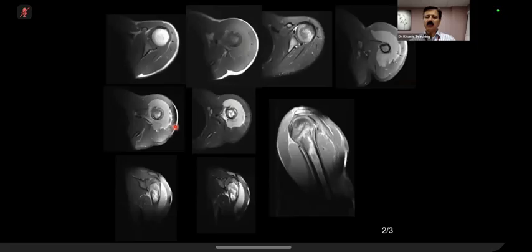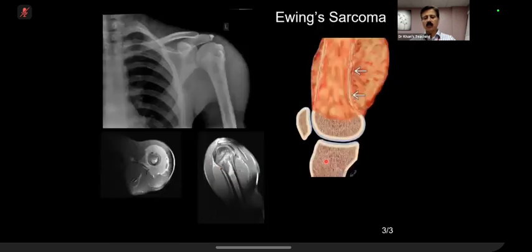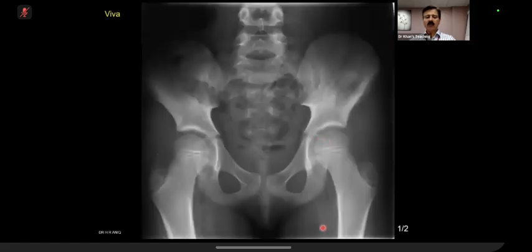Number two, lymphomas in this age group with this kind of radiology are much rarer. Out of 100 cases, maybe 5 of them might be lymphomas. But radiologically speaking, yes, lymphoma can be kept in the differential with this fine print that the soft tissue might not be as much. So this is classical Ewing sarcoma, and this picture also tells you what happens. Another observation film. I think the second last of the day. Over to you.